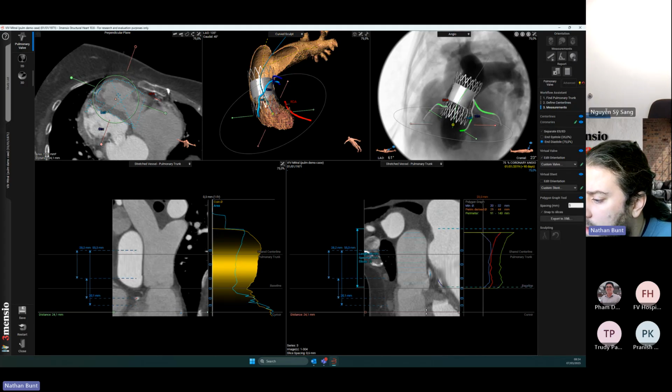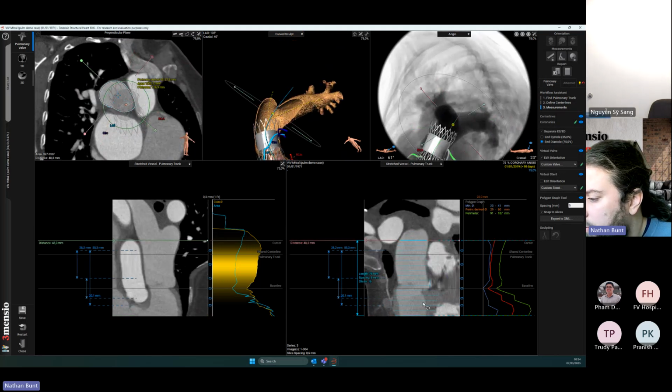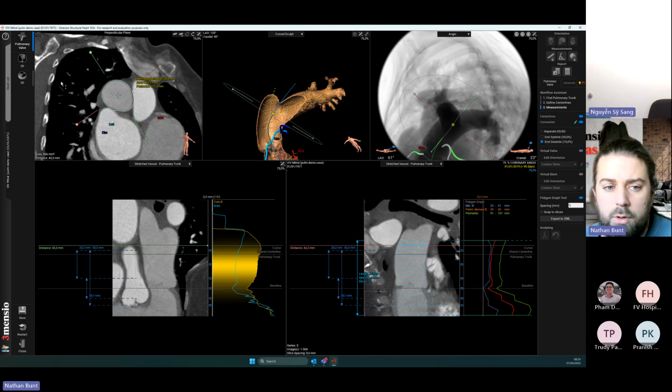When we click on the eye icon, you can choose the distal and proximal borders, and then we'll plot for you the entire anatomy in a graph form, basically, where you can see the minimum diameter, the perimeter, derived diameter, and the perimeter as well. And this is based on the automatic polygons that you can see in the top left corner.